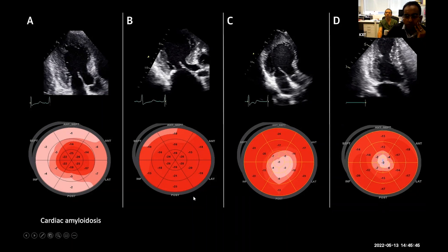What about in terms of panel B? Is that 10 at the septum? It is, isn't it? Those numbers are 10. Yes, maybe like an infarct or some kind of ischemia. Septum's down. Septum is the base. Regional sort of change. So points have been raised whether it could be an infarct. Anything else? Have a look at the B mode image. It's pretty chunky.